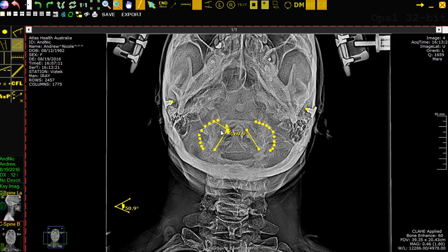So what we've created from this anterior point 1 right here is the point where this perpendicular line intersects with the lateral mass, and we call this anterior point 2, or front point 2. What we need to do next is the exact same thing for posterior point 1 to identify posterior point 2.